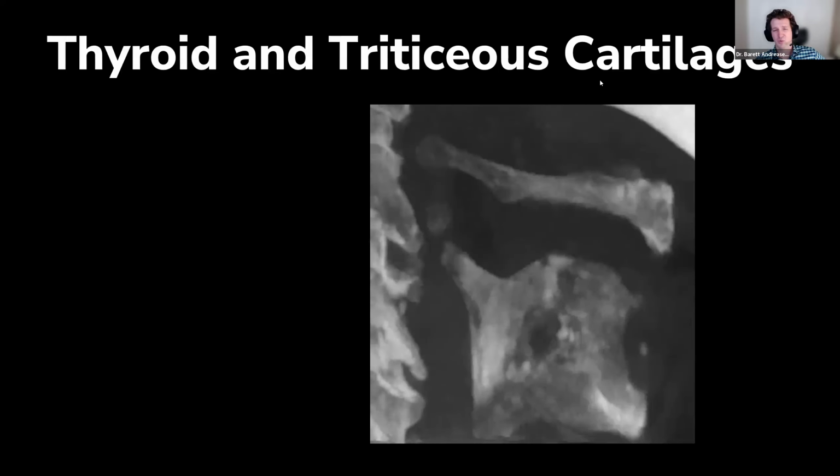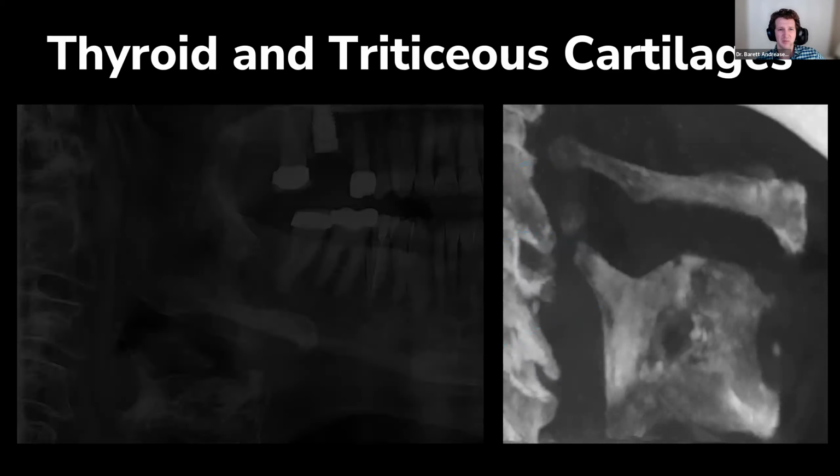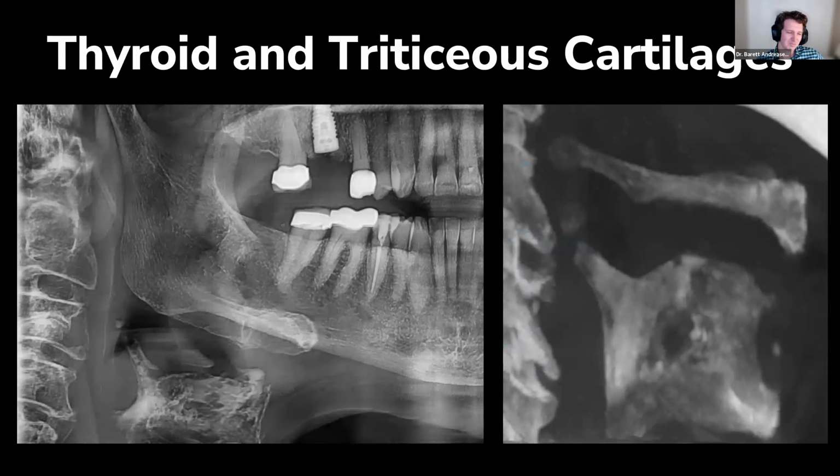And these are other normal physiological calcifications that occur. These typically occur after adolescence. So the patient hits probably their 20s or so, and you start to see calcifications of these cartilages. Again, totally normal, but we need to be able to identify what's normal.